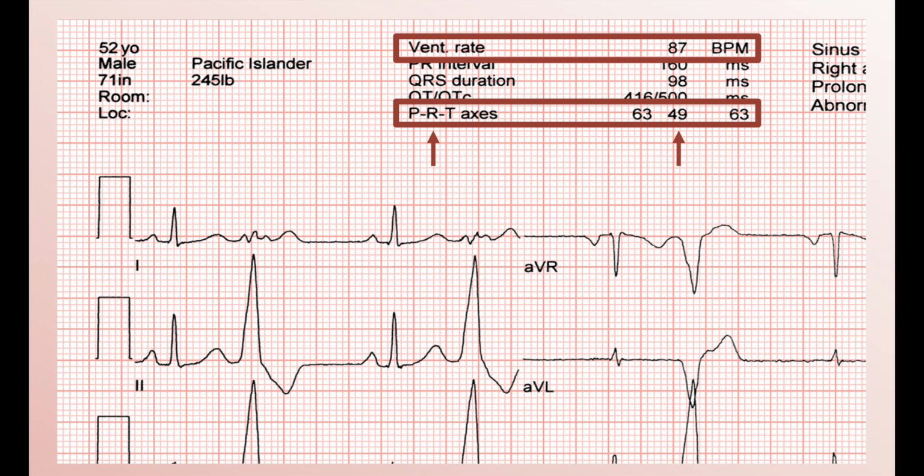As with the rate, the algorithm rarely miscalculates the QRS axis, doing so only when the patient has an indeterminate axis discussed later in this lecture. However, the manual determination of axis serves as an excellent practice by which the medical trainee can become familiar with thinking about the directionality of the electrical processes of the heart with respect to the location of specific EKG leads.